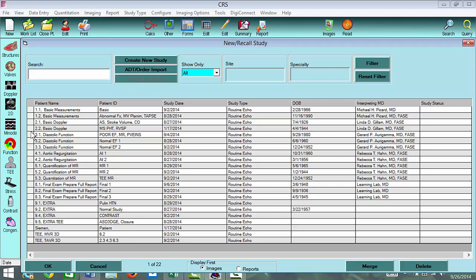I'm going to review the software that we're going to be using in the Learning Lab. It's called Digisonics. As well as the software, we can look at your cases, and if you have any questions, you can give me a call.